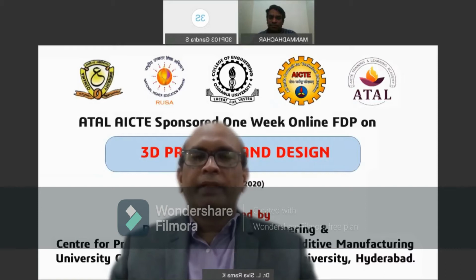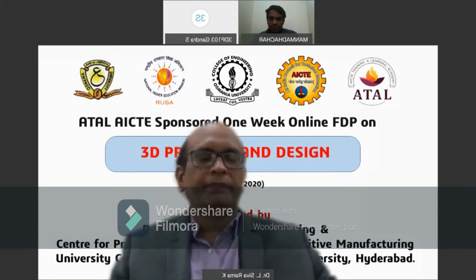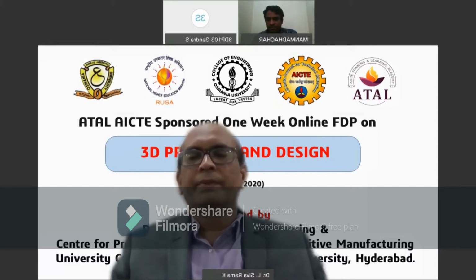But now we are going to have a hands-on practice today on biomedical modeling using 3D Slicer, as well as the STL file, and how you slice it in the CURA software before you produce the part in the machine. Because, as I said, in 3D printing, this preparation stage is very important. Designing as well as setting the parameters before you print is very important. If you commit any mistake here, your final product will have an error. So this is a very crucial step.